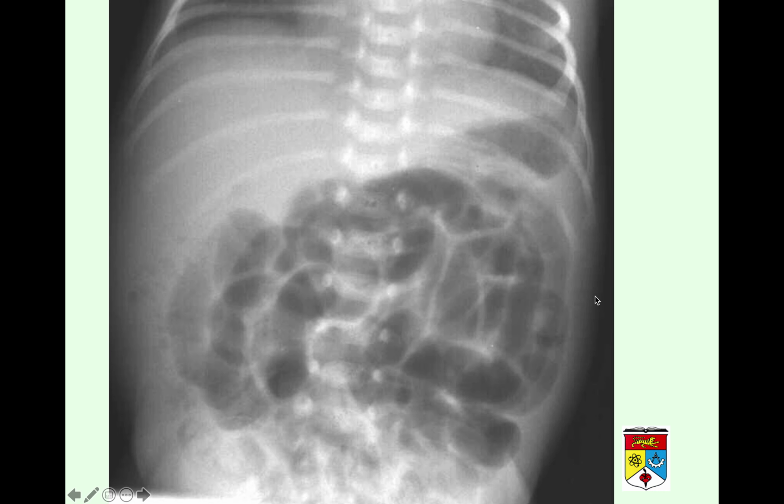Here you do not see a loss of liver opacity, not too bad, but you're not sure whether there is any Rigler's sign that has sandwiched the wall, whether the wall is intraluminal here and extraluminal outside. So we are suspecting a pneumoperitoneum, but not as convincing as the other radiograph just now.